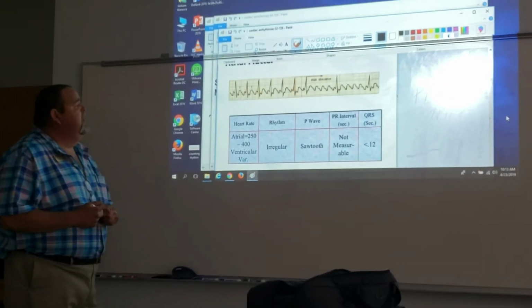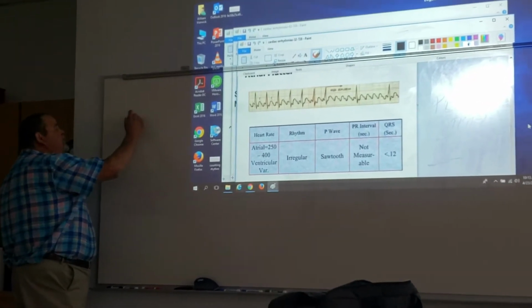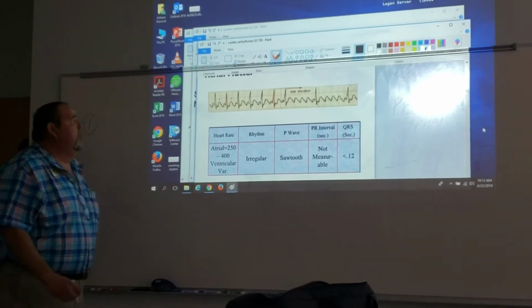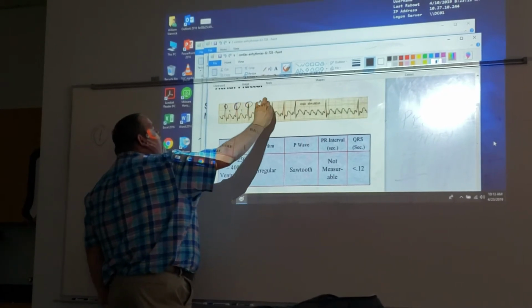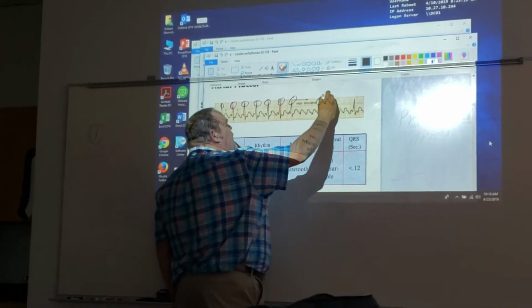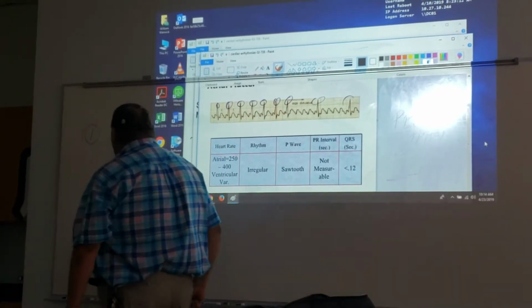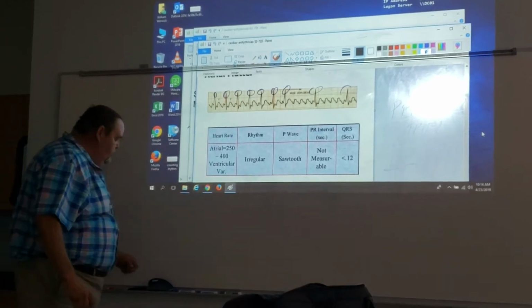Now, the next rhythm we're gonna do, with your steps. Number one, we want to rate. 1, 2, 3, 4, 5, 6, 7, 8, 9. Heart rate is 90. All right?